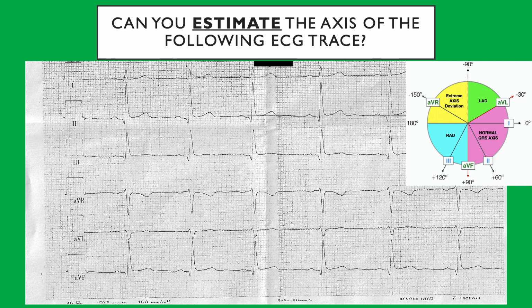So you think about 60? Yeah, above 60. Not by calculating the squares and doing all this process, just by looking at it, you say, I think it's here, I think it's there. Just by looking at the ECG. Between 60 and 90. Okay, how did you find it?